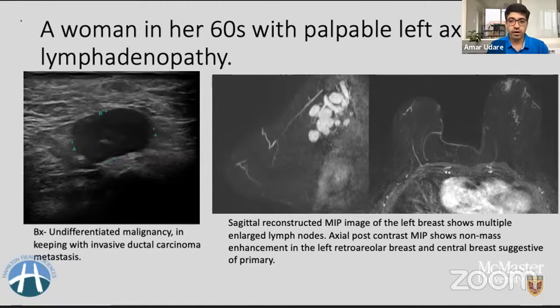So coming back to what we were discussing, the burden of axillary metastases is quite high as compared to what is happening in the breast. Especially if you look at this tiny retroareolar enhancement, the nodal disease is pretty large. The reason why this happens is because there is an increased propensity of ipsilateral axillary lymphadenopathy if the breast carcinoma is present close to the nipple or involving the nipple areola complex. Anyone who knows about this may correlate to that based on their anatomy knowledge.